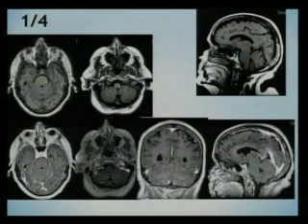Okay, here's another patient. And up here you have the T1 without contrast. A little bit lower, T1 without contrast still. And then the coronals and the sagittals. This is without contrast up here, and with contrast down here.